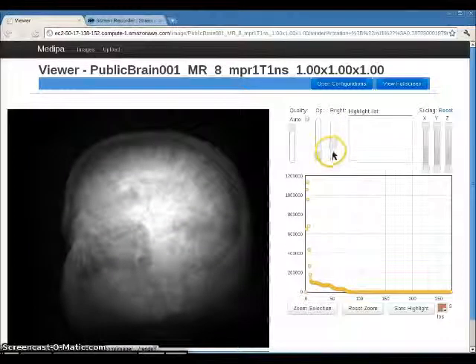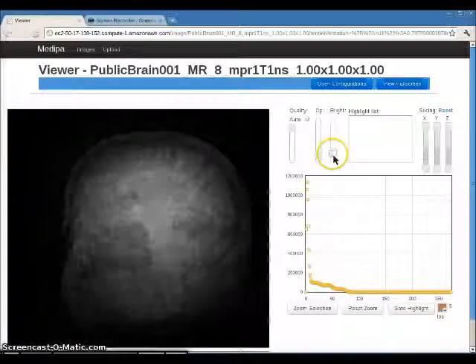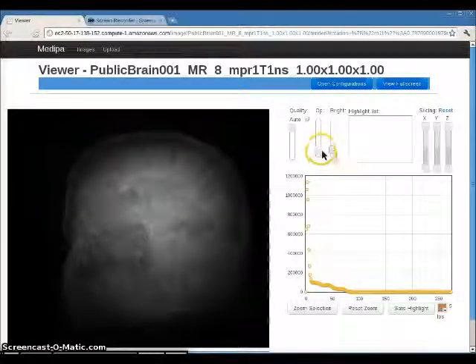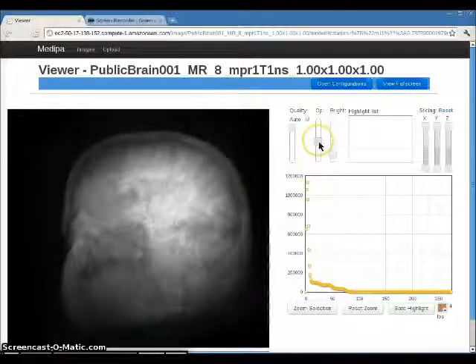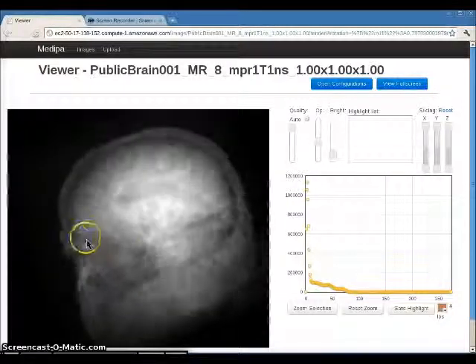We also have brightness and opacity controls, which allow you to, as they sound, adjust the brightness and opacity of the image. Depending on the image, you may have to adjust things differently. Also, when we get into cutting, you'll see that adjusting the brightness is very important.